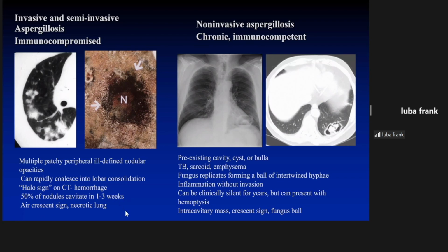The necrosis is going to evolve as well, and we're looking for the air crescent sign that also indicates presence of necrosis.